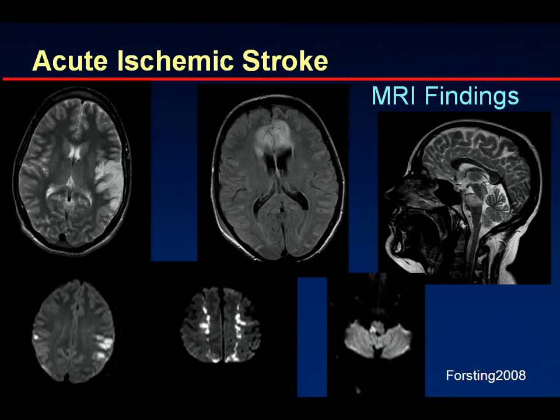If you see that, then this is not a classic infarct, but a secondary infarct in a patient who had an aneurysm of the anterior cerebral arteries that had been clipped. Actually, it had been clipped successfully. The arteries were still open, and then the patient developed a vasospasm. So the vasospasm caused that infarct. And vasospasm is the biggest problem in the treatment of subarachnoid hemorrhage patients.